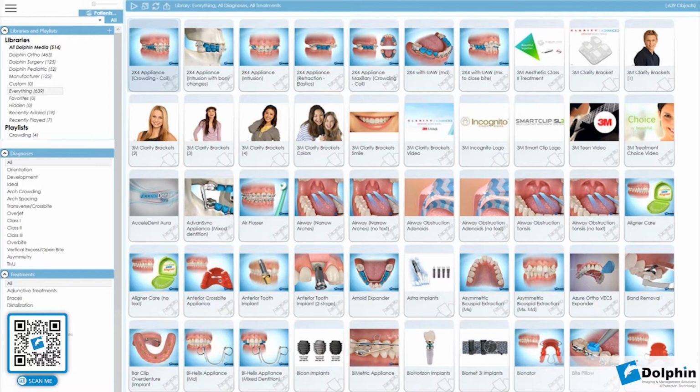So for today's subject, we will be doing it on Dolphin Aquarium. Now, Dolphin Aquarium is a very, very nice product to help educate your patients to increase case acceptance. And with today's economy, it's very difficult. You want to increase production in your practice. So talking to the patients while you're in your consultation room, going over treatment.